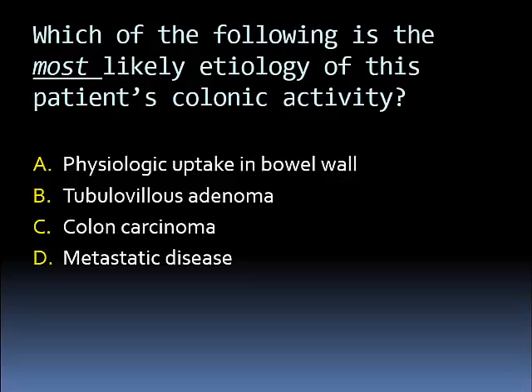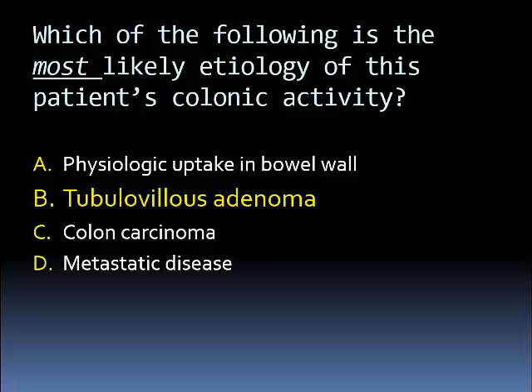Is it physiologic activity in the bowel wall? Is this a tubulovillous adenoma? Is this colon carcinoma? Or is this metastatic disease from lung carcinoma? Good, so almost everyone got this one correct. So the answer is indeed tubulovillous adenoma.